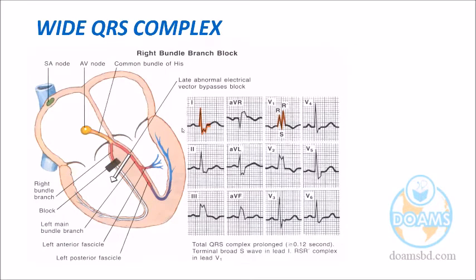If you understand the ECG orientation in the chest or in the limbs, which are the left-sided ECG leads? V1 is the right. V5, V6, these are in the left. If you can remember that axis and others, you can easily understand. If we consider the chest leads to make it very easy, from V1 up to V6, V1 is the right-representing lead. V6 is the left-representing lead.